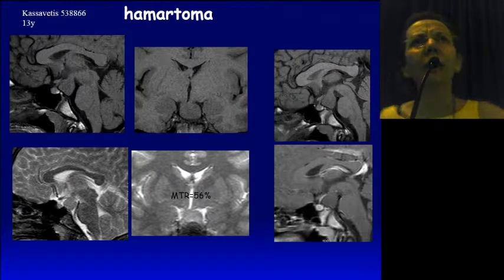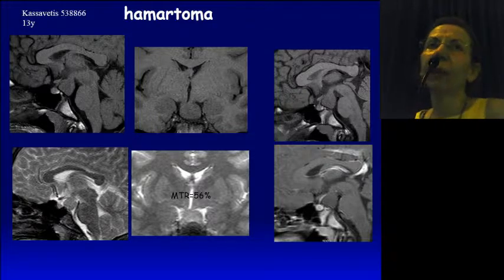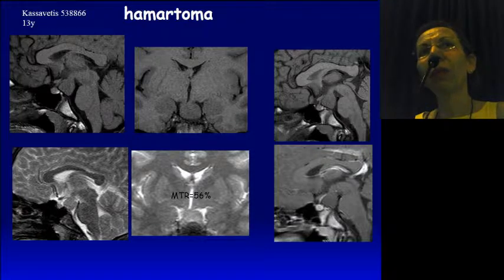And it is very interesting to go and see what happens to these hamartomas by using magnetization transfer imaging. We can measure the magnetization transfer ratio. And as I told you before, the magnetization transfer ratio increases as a function of age in the normal pituitary gland. So our question was, what do we do about hamartomas? Because they are responsible for precocious puberty. Are they secreting something?